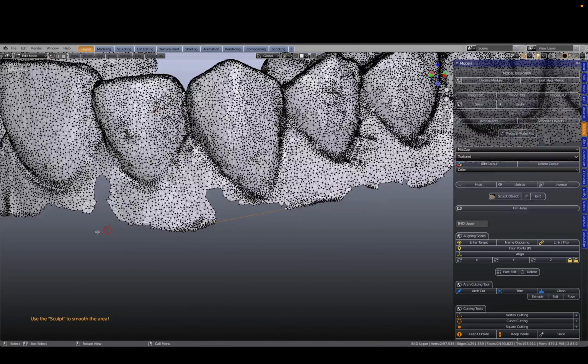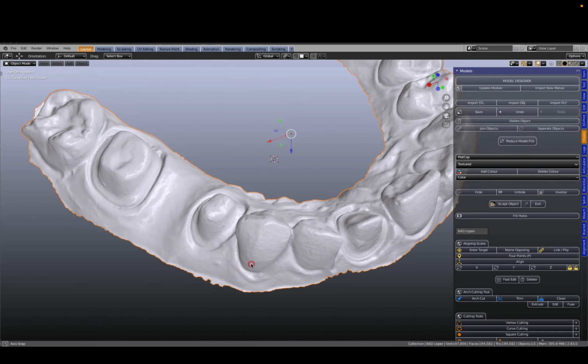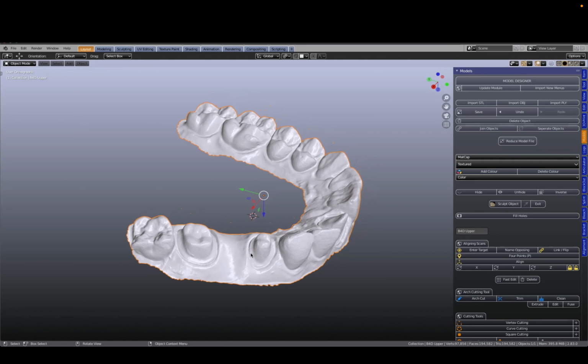With this, we will conclude the tutorial. The process of editing the scan usually follows a sequential process. First, highlight and delete the areas which are not needed. Then seal all the holes, and bridge all the rips. Use the Fill Holes tab to plug the holes. Finally, fine-tune your work with the sculpting tool.